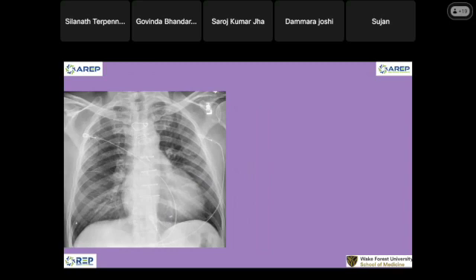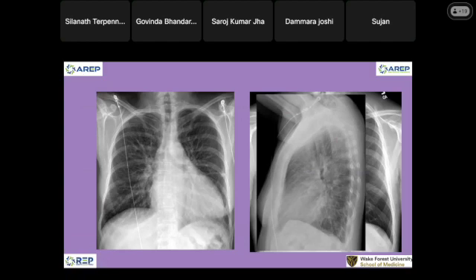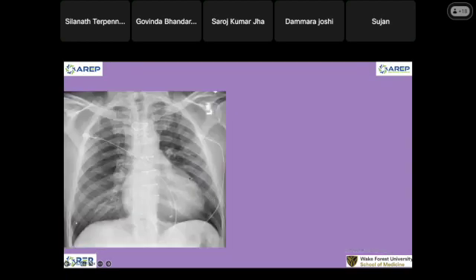What about this case? Okay, let's look at this. This is an interesting chest radiograph here. So the cardiac shadow is enlarged. The whole cardiac. This one, are you talking about this one, right? The new one, right? Yes. I think this is suggestive of pericardial effusion, the water bottle sign. This one has pericardial effusion or not? This one I am not sure. Normally, if it's not a slam dunk, we can't see it on chest radiograph. You see it better on CT. And normally, let me show you tomorrow how the pericardial effusion on chest radiograph looks like. Okay, I will find a case and then we show it to you tomorrow.